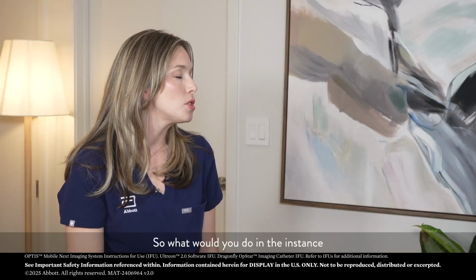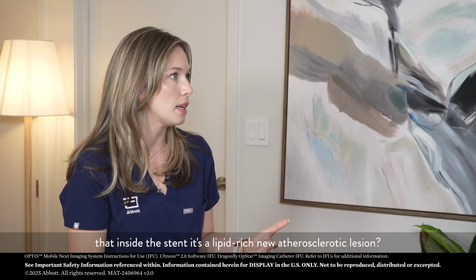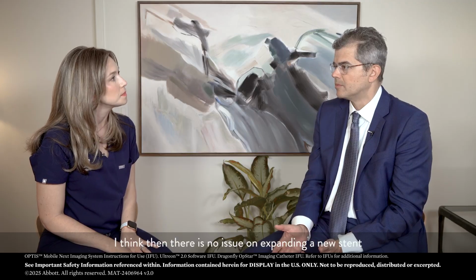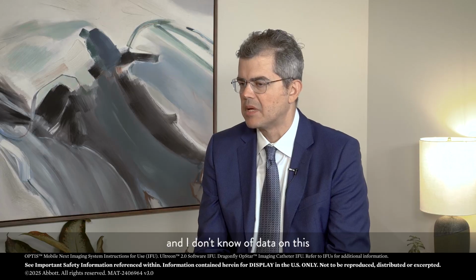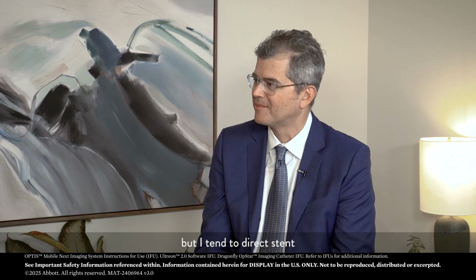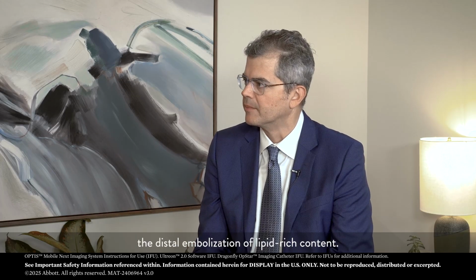So what would you do in the instance when your OCT is showing that inside the stent it's a lipid-rich neoatherosclerotic lesion? I think then there is no issue on expanding your new stent, and I don't know of data on this, but I tend to direct stent and avoid manipulation, probably preventing distal embolization of lipid-rich content.